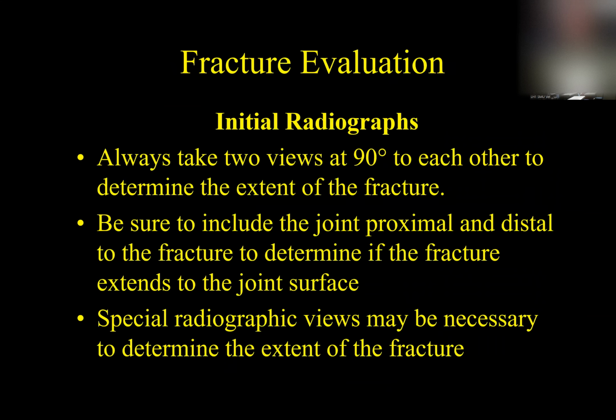Okay, fractures. Now we have to talk a little bit about fractures and how to classify them, how to characterize them, and talk about them. Okay, so remember, always take two views, orthogonal views, just like that early on, the first slide, that elbow. You're going to miss things unless you take two orthogonal views at 90 degrees to each other.